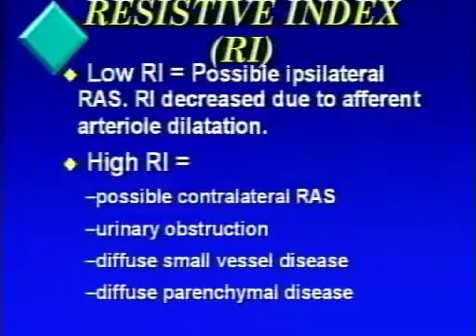So just like other areas of ultrasound, it's a matter of taking all the pieces of the puzzle and putting them together and determining whether they correlate together. And in the case of the indirect method, if they don't correlate, then that would be an indication that you may need to move on and do the more extensive evaluation using the direct method. But typically, the indirect method is a little bit quicker.